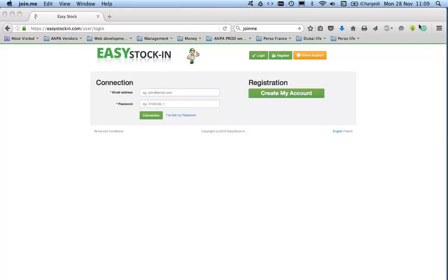Not only that, but several people can communicate at the same time and get access to EasyStock-in at the same time, such as the accountant, the laboratory, the secretary, the assistant, and the doctor himself. So let me go inside my program.